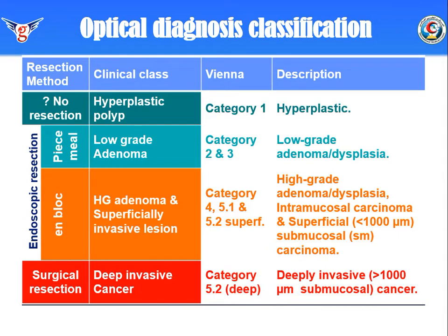Class 3, that should be resected en bloc to enable pathological assessment of lesion margin and base for invasion status. And it includes high-grade adenoma and superficially invasive lesions. And finally Class 4, that should be resected surgically and includes deeply invasive carcinoma.